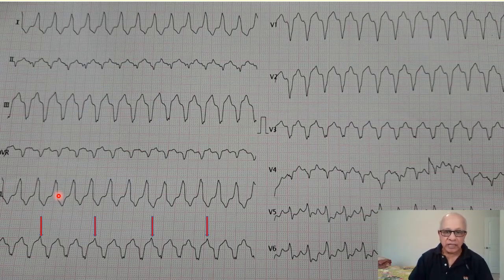Okay. So there is P wave dissociation. The P wave is at a rate of around 75 only, whereas the QRS is very fast. I told you, 166 per minute. So AV dissociation is definitely there, which is also a diagnostic point in VT. So you have enough points in this patient to say VT. Now Josephson's and Brugada's criteria, that you have to see in an enlarged picture, which I will show you in the next slide.